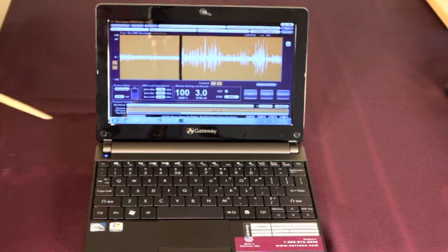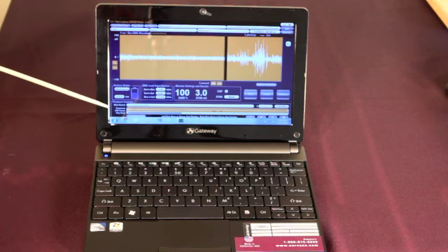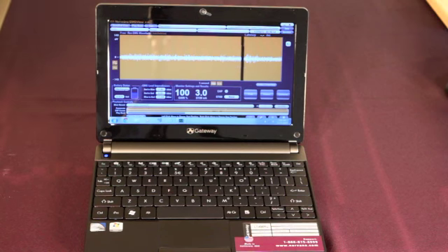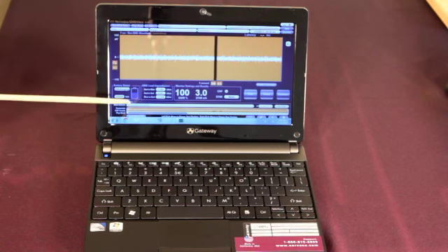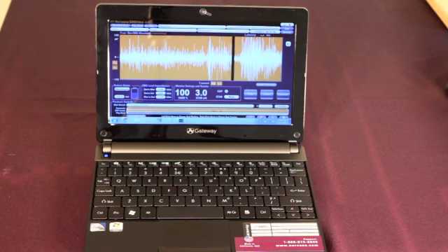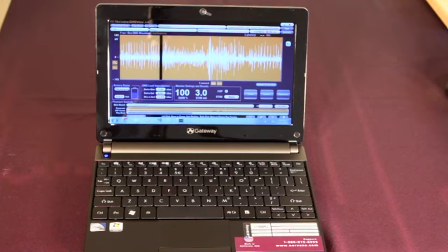Below that, we have an indicator bar that's labeled Comments that tells you with little marks, either black or white, where the comments occur during the case. The white marks are text comments, and the black lines or marks indicate that the test button of the Nirvana was depressed. That's often a nice way to mark a significant event, is to just press the test button, and that'll leave a black mark along the playback timeline.